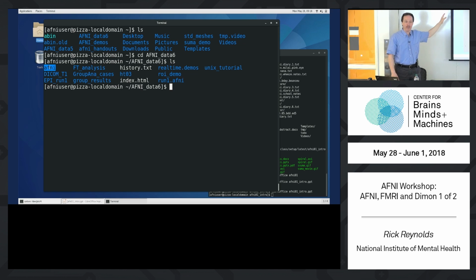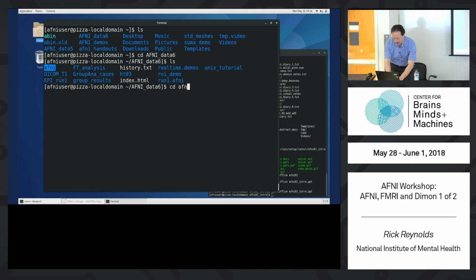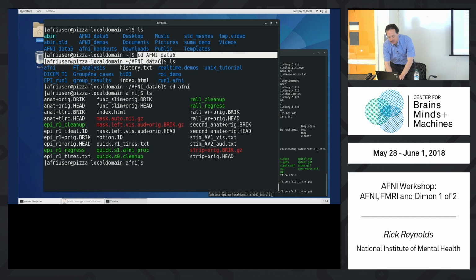We didn't start doing that. Some users started doing that, but we took it on, and now we've got AFNIs floating all over the place. So that'll be a little irritating and confusing, perhaps. But anyway, let's cd into that AFNI directory. So I went into AFNI_data6, and then into AFNI.